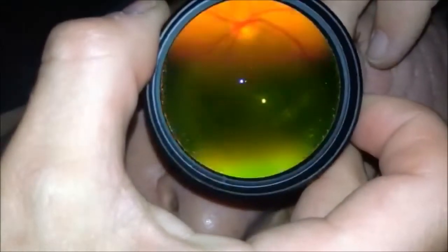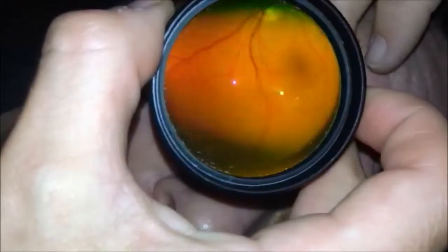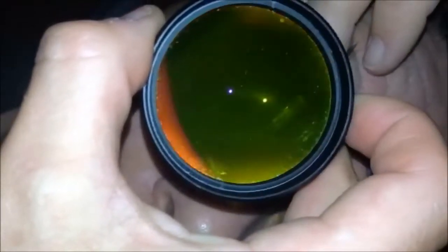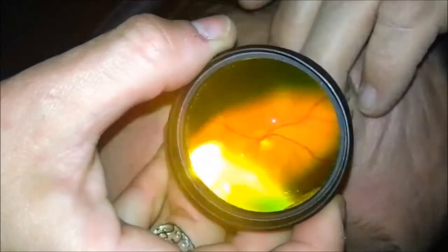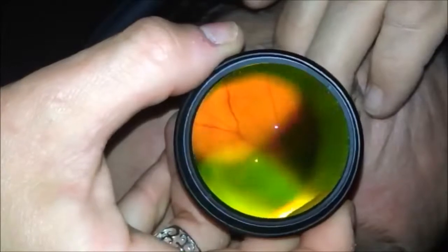In recent years, we have witnessed a revolution in the way visual information is recorded, stored, displayed, and accessed. In the era of fast-paced technology, digital imaging is revolutionizing the medical world. Retinal imaging is one of the most used tools in ophthalmology, and currently many adapters and handheld devices allowing examination of the fundus are available.